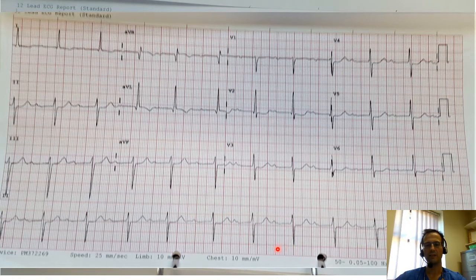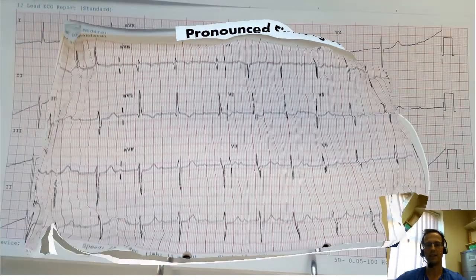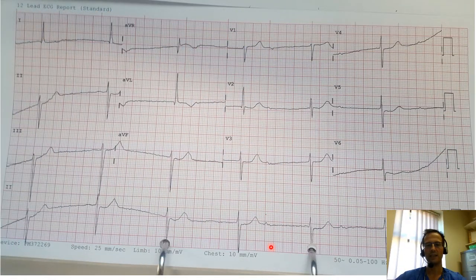And in fact, this patient had an aortic root abscess, and this was their ECG a day or two later, as the PR interval has profoundly prolonged. And this is the kind of ECG that makes you very concerned that the patient's going to develop complete heart block.